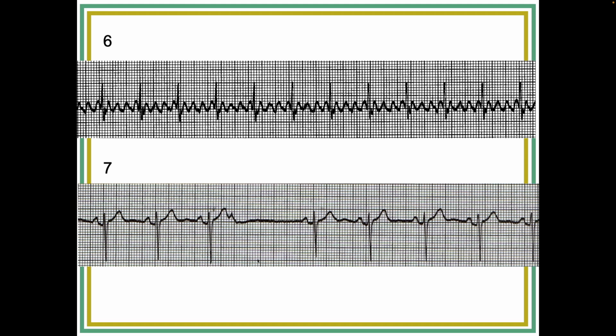Now, how do you define an escape beat? It is an atrial complex, but it comes late. So which one are you calling that? Wait a second. Do you have the pointer? There it is. Show us. Well, I was calling it that one, but that's normal with this. That's regular.